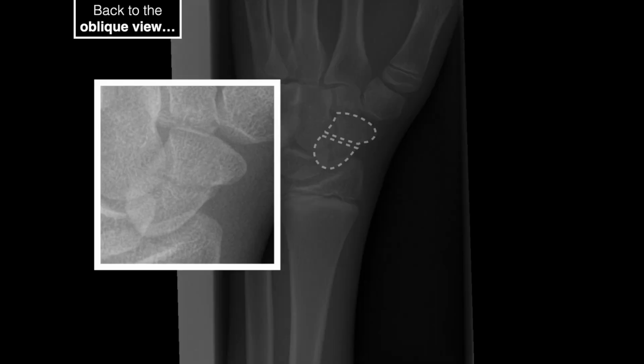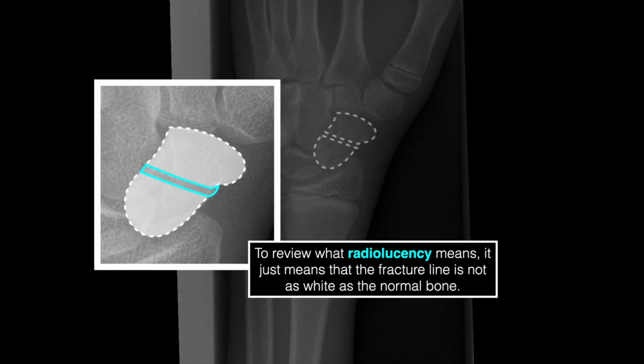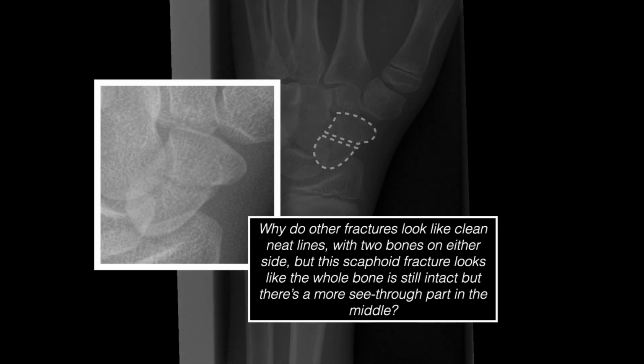Back to the oblique view, the way you tell that there's a fracture here is the radiolucent line running through the middle of the scaphoid. It goes all the way across. So that line that's a little bit darker than the surrounding bone, or a little more transparent looking, is the radiolucent line. Why do other fractures you may have seen look like clean, neat black lines with 2 fragments on either side, but this scaphoid fracture line just looks like a slightly more radiolucent strip in the middle of the bone?